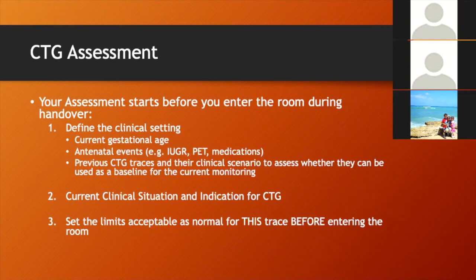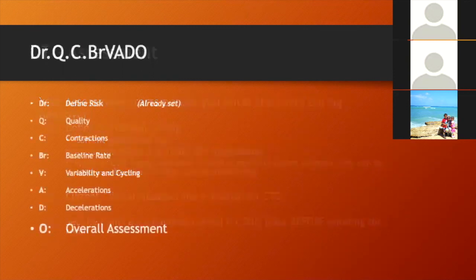So what do you think the normal is going to be for this baby? 140, but there's 120 at some point. Remember, it was 140 at 28 weeks, remained 140 at 36. At 38, 39 weeks, it was 130, 120. So a range between 120 and 140? Should it be 145, 150? Is that normal? Normal for many babies, but not necessarily for this baby. This baby was 140 at 28 weeks. It shouldn't be the same at 40 weeks and 2 days today.